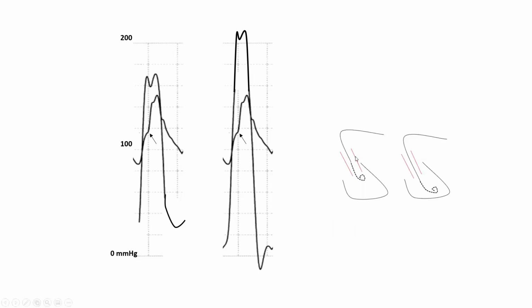Well, it's fairly simple actually. In the second recording, the true recording, your LV pressure is deep. We're using an LV catheter, an LV pigtail catheter, multi-hole catheter, okay? So this is your LV catheter. Now imagine that pigtail is not very deep. It's halfway across the aortic valve.